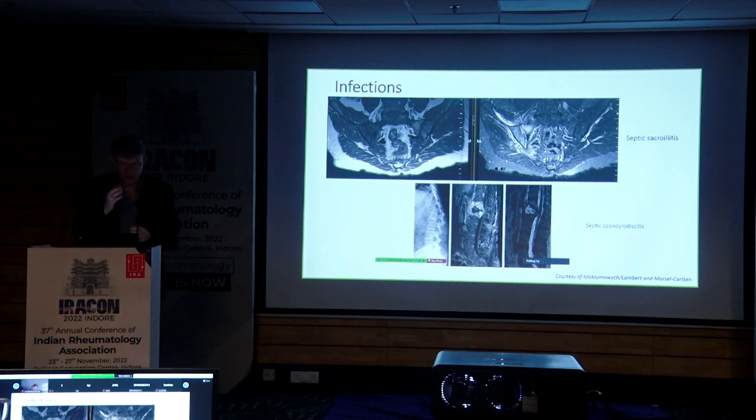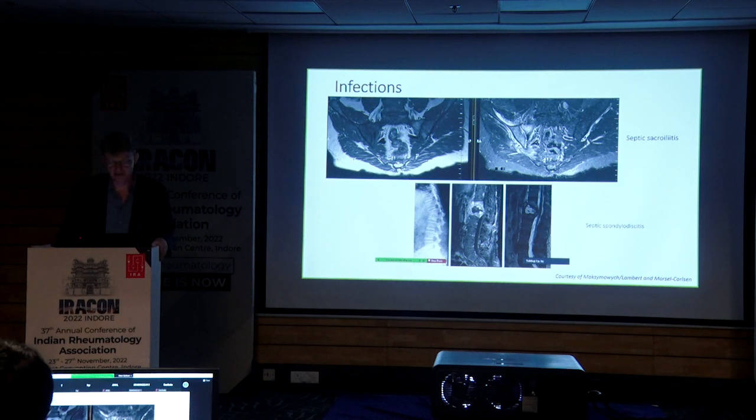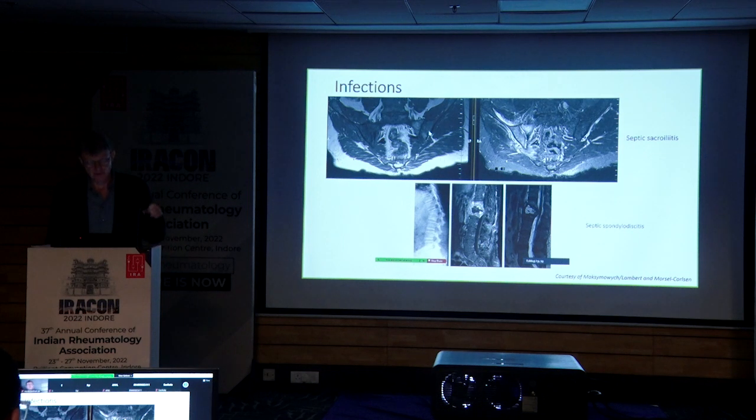Infection is also brought up as an important part. The classical infections have a different presentation, with a lot of pain, fever, CRP elevation, leukocytosis, and then massive changes like unilateral severe inflammation. That's one thing. Unilateral severe, a lot of bone marrow edema, and spreading into the soft tissues, like this. That's the typical. Here in the spine, massive inflammation spreading into the soft tissues. That's the key thing, and that will also be found when it's severe.